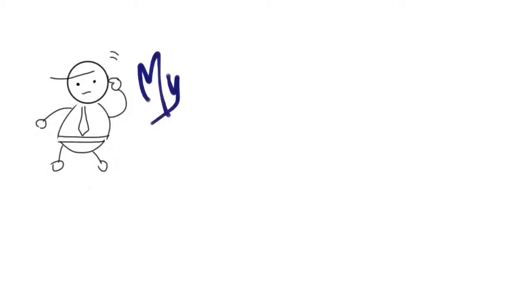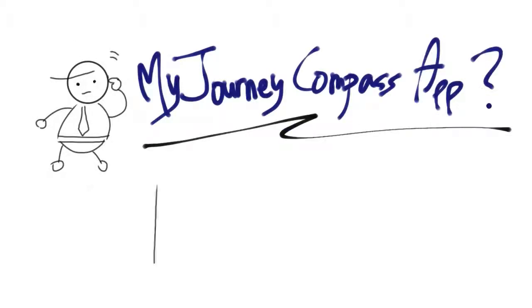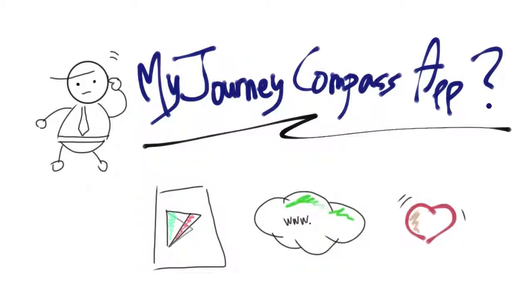What is MyJourney Compass application? It is an application that is designed to help breast cancer patients to track their symptoms.